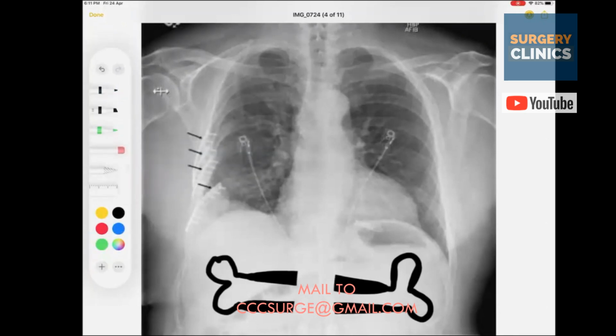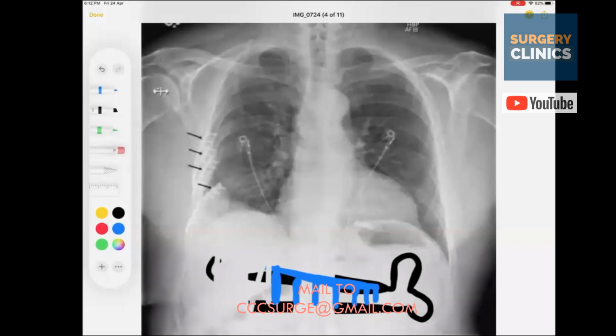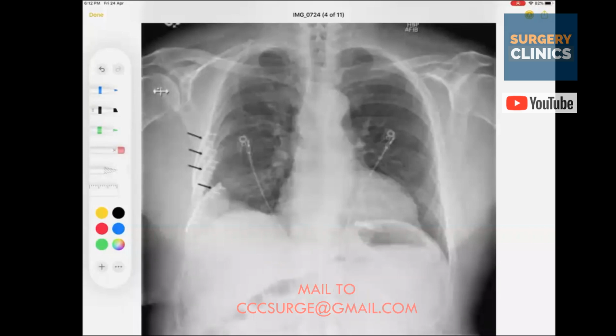Do you know what an orthopedic surgeon does? He uses plates and small screws to fix it. Remember that. This is exactly what I wanted to show you: rarely in your exams will a rib fracture appear, but this is something that has been done to fix a fractured rib, which is a rare thing to be done.